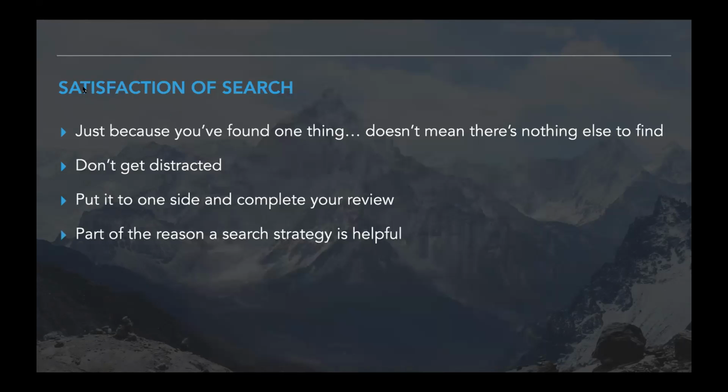The reason I bring this up is because of something called satisfaction of search, which is a category of radiological error. And just because you found one thing doesn't mean there's nothing else to find. So it's like if you're looking through a load of radiographs for a trauma patient, you might see an abnormality and go, oh, okay, they've got a fifth metacarpal fracture, I'm going to stop looking. But actually, they've also got a scaphoid fracture and a base of first metacarpal fracture, and so on.